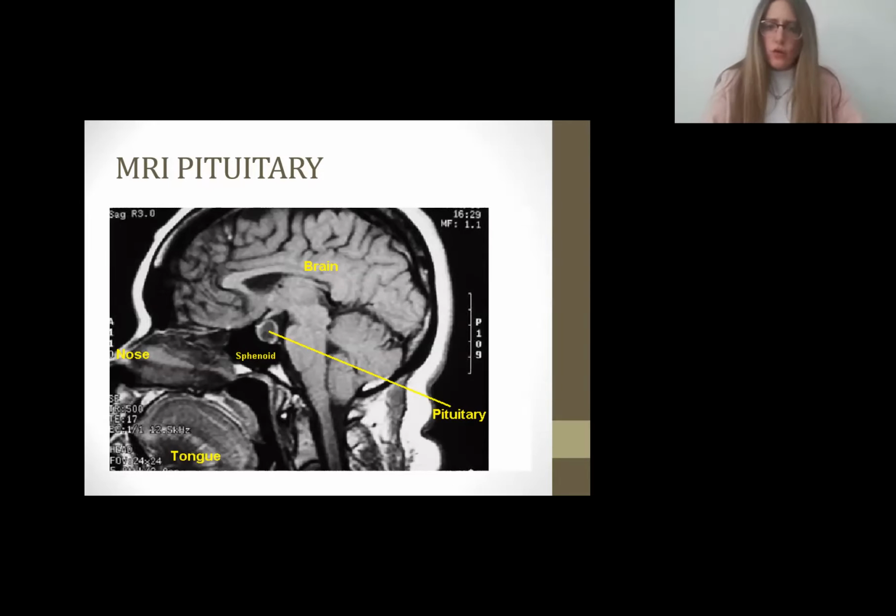A patient has prolactinoma, growth hormone producing adenoma, etc. You have to know what you're looking at, okay? And this is the exact place for, let's say, the pituitary. And do not be surprised, you will be asked.